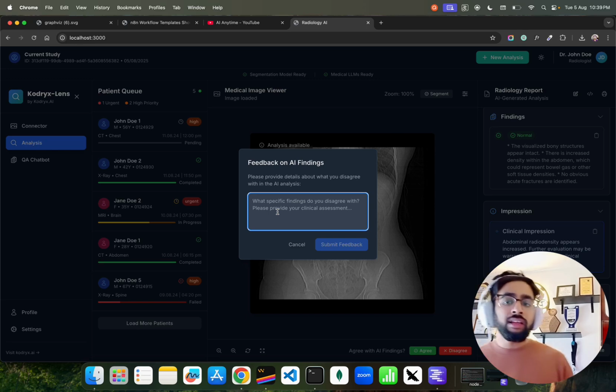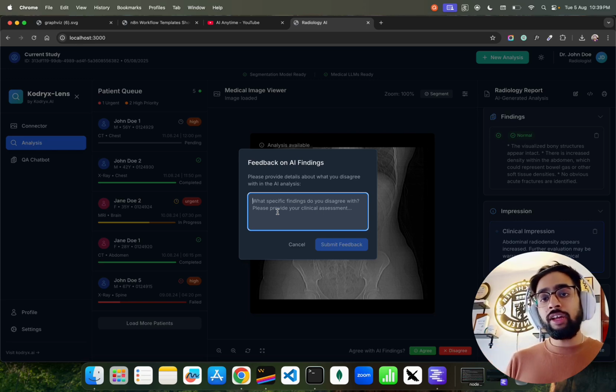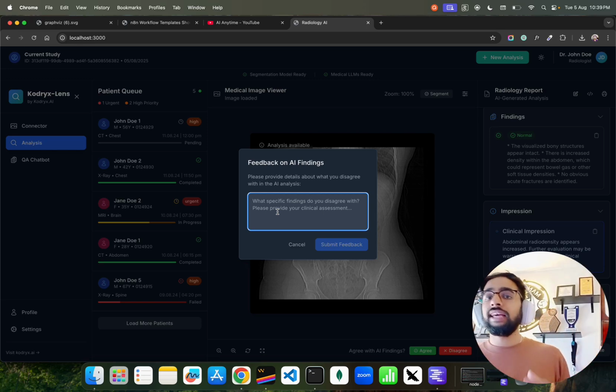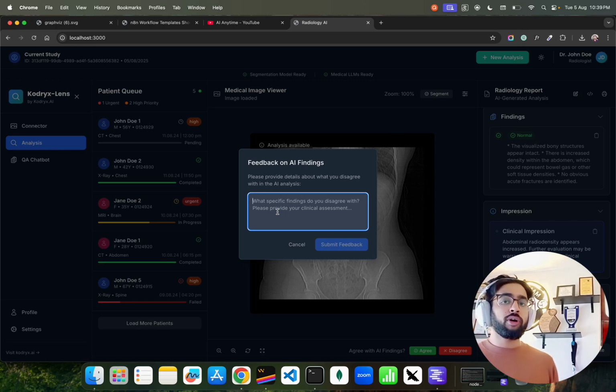The reason being, because I want to collect feedback data also, right? That will help me later fine tune. When I'm fine tuning on this feedback data, I can align the model better because these are all open source models. I can control it better when it's open source LLMs, right? Medical LLMs. I'm using MedGemma behind the scenes as a large language model, as a medical model.